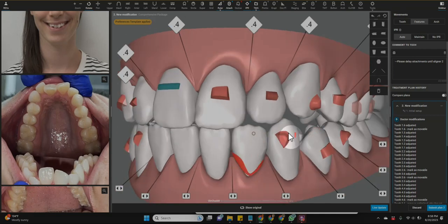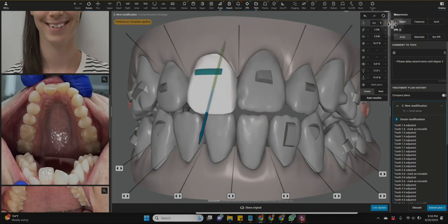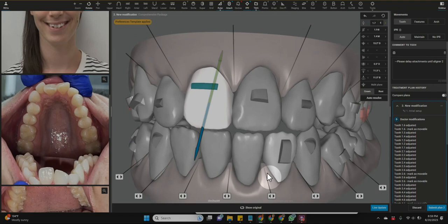So this gives you an idea of how I would set up this anterior open bite. And from there, we can do a little bit less extrusion of the anterior teeth on the ClinCheck, knowing that the posterior may possibly intrude. We might reduce our OVD, and then this interocclusal space should be less clinically.